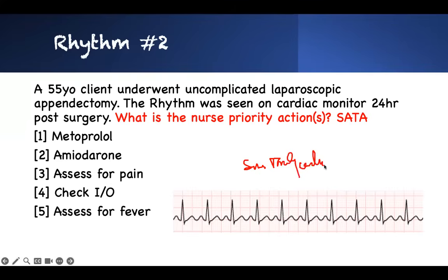This is a very tricky question. It can trap you. Every time on your boards you see sinus tachycardia, never treat it with medication. Until you know what it is, medication is the wrong answer. There's a reason why people's heart rate goes faster, and it's sinus tach. The QRS is fine, the P is fine, the interval looks fine, except the rate. I don't see anything worrisome, the shape looks okay. Sinus tach is always a manifestation of something bad happening. So don't treat it with medication now.